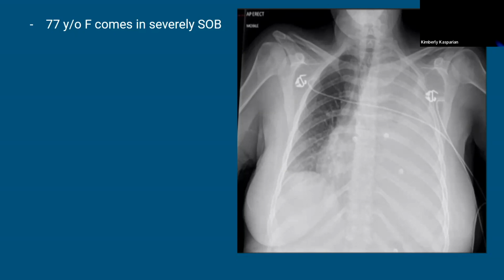That's literally the two differentials: is this lung totally atelectatic, have they mucus plugged off this whole lung from a left main? Or is it fluid around the lung that's filling up to here? So this is for the gift card. How do you know if this is a pleural effusion or if this is atelectatic? And you've already, nope, look at the chest x-ray. Oh, the ultrasound machine is broken. Look at the chest x-ray now.